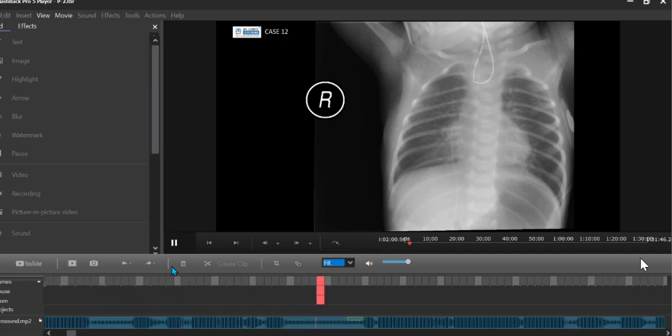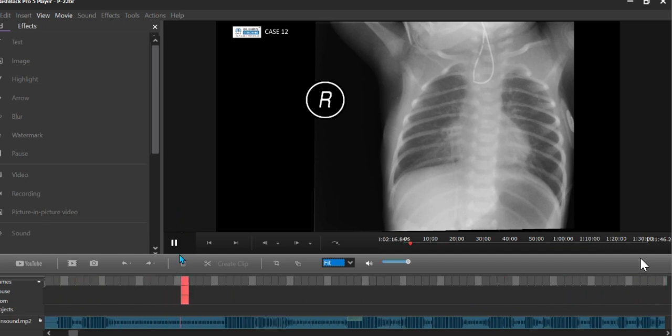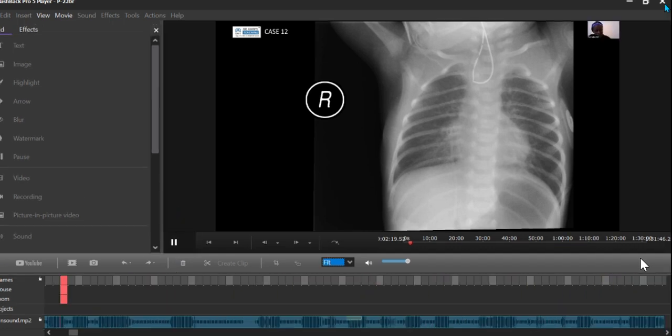Is this an infant babygram of an immature infant? I didn't see an ossification center, ossification of the upper limb. I see there are two lines, an umbilical arterial catheter, which is going through the chest. I think it's in the proper position, in the correct position at the upper end. I see the umbilical venous catheter, which is going to the right.